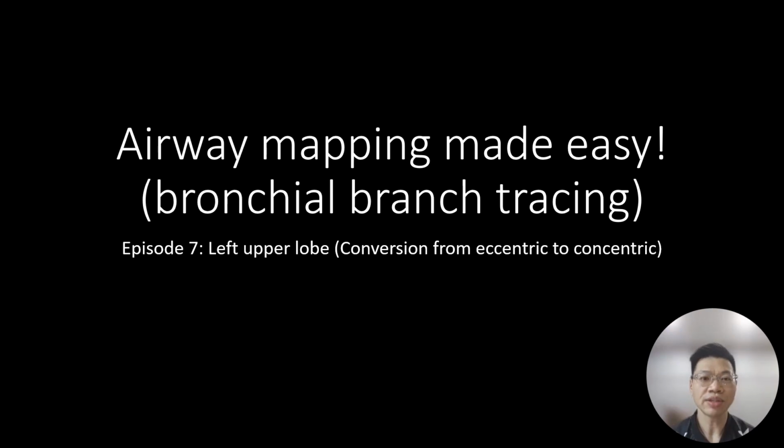Hello and welcome to the 7th episode of Airway Mapping Made Easy, the video tutorial series where I share how to convert a CT thorax into a hand-drawn map for bronchoscopy. I'm Pip, an interventional pulmonologist from Woodlands Health, Singapore, and in today's video I will be taking you through an airway mapping of the left upper lobe.